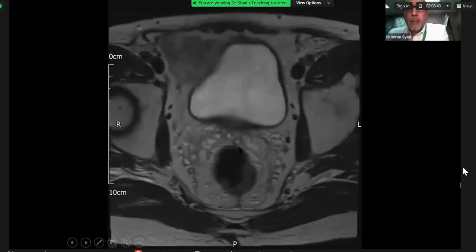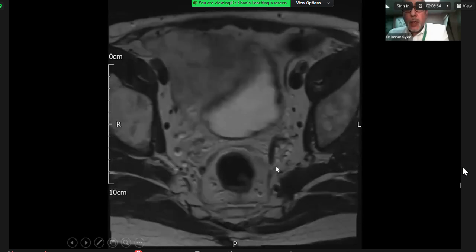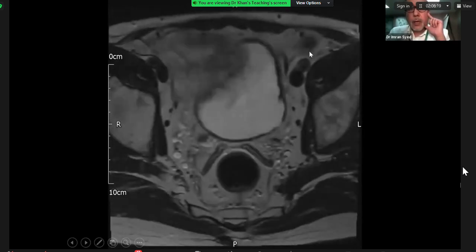So if we come back out, the vas deferens here, they come here, lying on the mesorectal fascia, the fascia of Denonvilliers. It does a U-bend and then starts to move ventrally. And you can see the calcification has also helped in terms of defining the path of the vas deferens. They move medial to the iliac vessels, and then they move laterally.